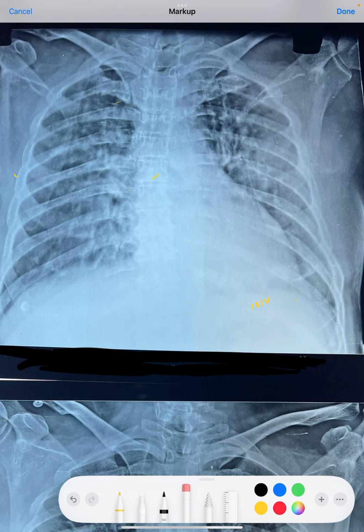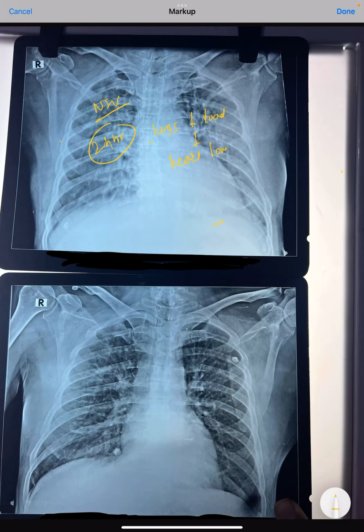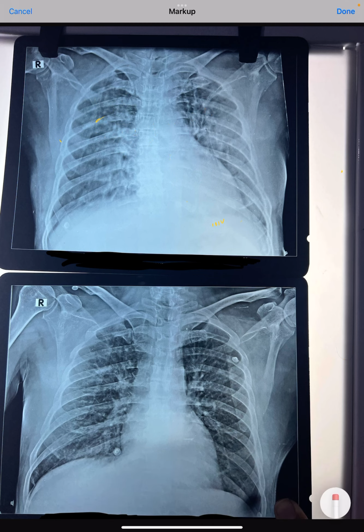So we did the same thing. The patient was put on NIV for 24 hours and he was settled within 4 to 6 hours, but we still continued the NIV support for 24 hours so that his lungs get a rest and get a reduced workload, because as the lungs get a reduced workload, automatically the heart gets a reduced workload, since they work in tandem. After 24 hours, when we repeated the X-ray, we can see the X-ray is much clearer than the earlier X-ray.